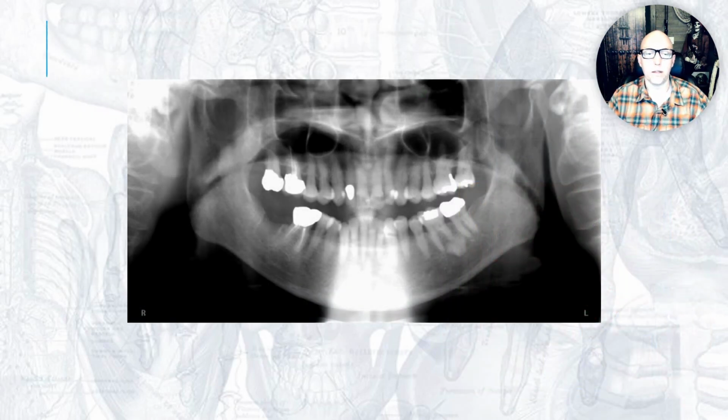All right, so what's going on in this one? This is the one I mentioned when I was showing that chart with all the different positioning errors, where you see a very pronounced ghost image of the spine. So what causes that? What causes more of the spine to be in the direction of the radiographs? That's when the patient's really slumped. They have the neck kind of curved forward like this. So if the spine is angled back, more of that spine is in the area where there's ghost image. So the x-rays project right through it.